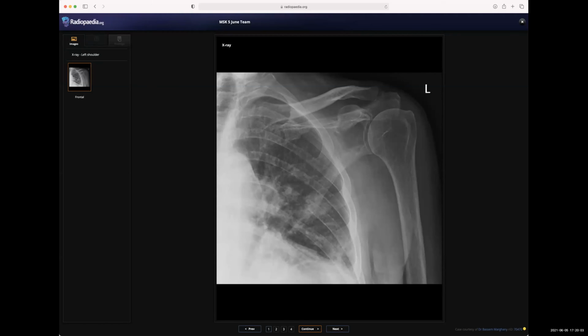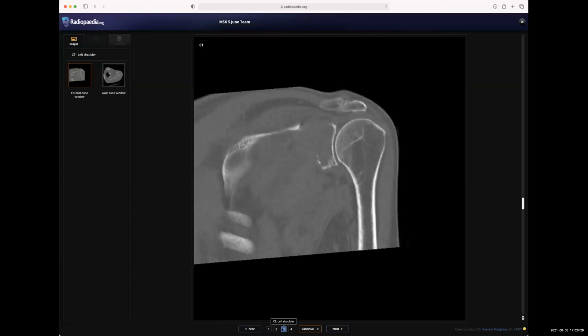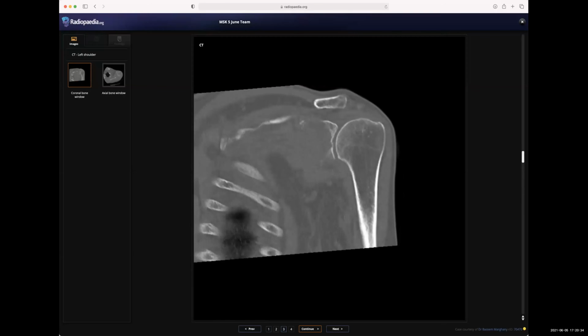But maybe this looks aggressive actually, and because of the multifocality, with the second focus on the medial aspect of the clavicle, even if it's not the chest primary, I would do the CT to see if there is a renal cell carcinoma, which can also lead to lytic expansile lesion and metastatic disease. He had the CT. Okay. I don't think the kidneys were included. The kidneys were also fine. Okay. So no, they were not included in the image.